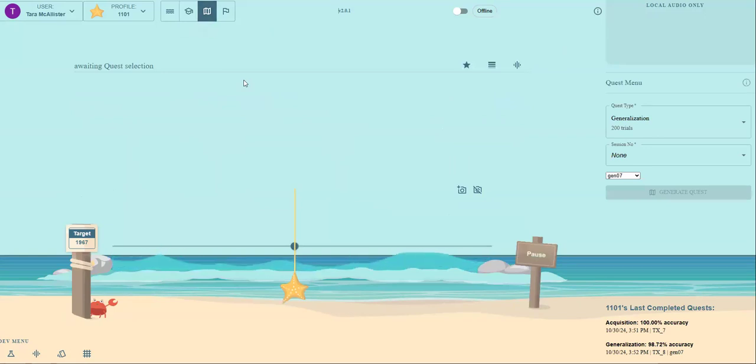There's also a quest mode that presents words containing R in structured practice interactions. The clinician can score the productions, and the difficulty of practice will adjust adaptively, such as presenting longer words when the clinician's scores represent a high level of accuracy.